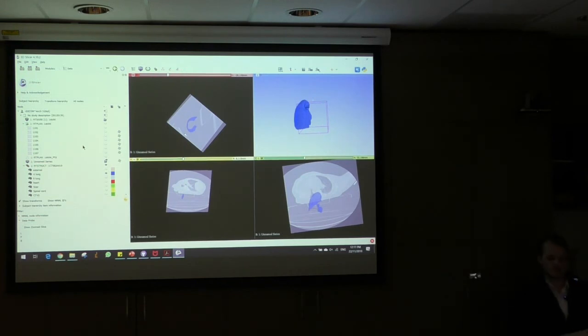Yeah, and I should also note in image registration, there is an automatic tool which you can apply for two CTs. So you could have your CT of a patient which has come in 6 months, and then perhaps they've changed in that time. There is a function in 3D Slicer that allows you to merge, almost one on top of the other, and do an image registration. I'd recommend looking at the YouTube tutorial on that one. I have not had the time to do it, sorry.